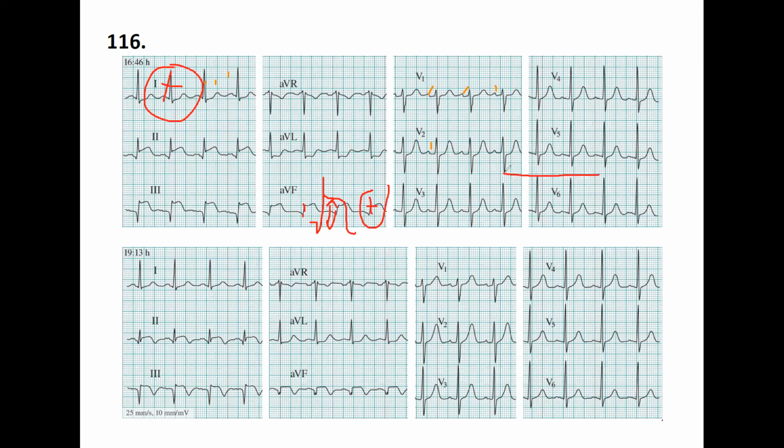So it means it's ranging from 0 to 90, so this is where we have it. And which one is it? Look at lead number 3. Lead number 3 is around 30, okay? Or if you are looking at AVL, again, you can say that exactly that 60.